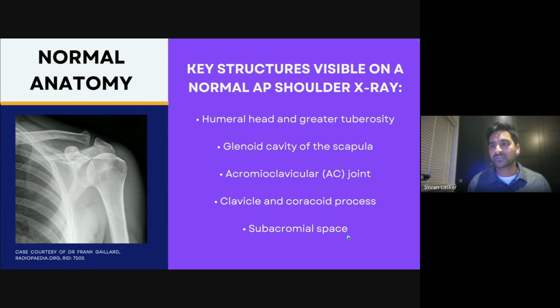And around here, you've got the subacromial space. So what does that mean? You can call it your subacromial space or your subdeltoid space. Your deltoid muscle, for those that are into bodybuilding, is the thing that people do lateral raises for, and they get really, really big. But underneath the deltoid muscle, you get a bit of fluid just to keep things flowing over one another, and that can get inflamed. That's your acromion, and you can get fluid just underneath it. Sub means below: subacromial, below the acromion; subdeltoid, below the deltoid. Same thing.